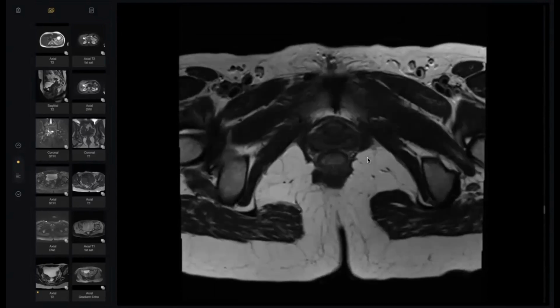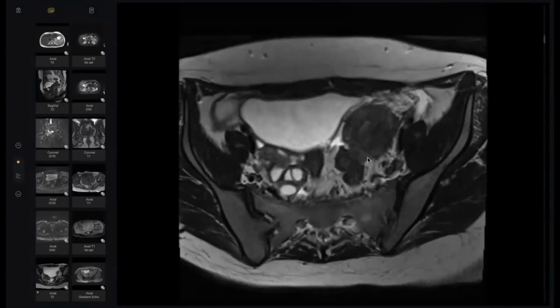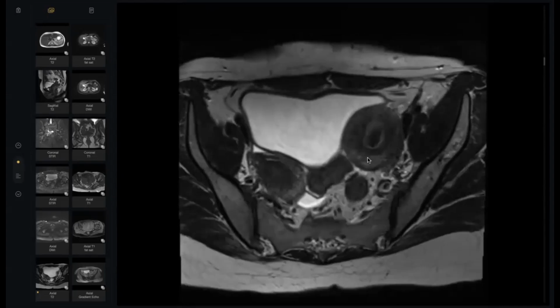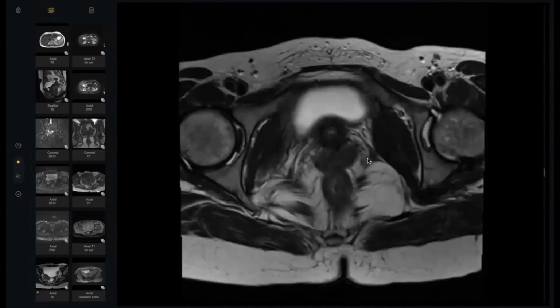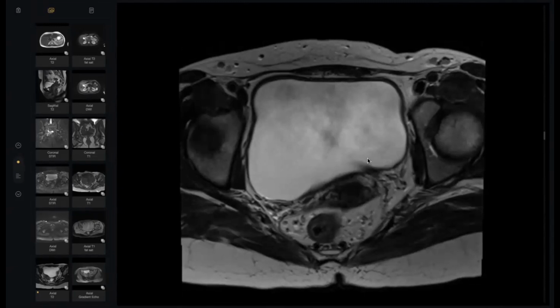On the T1, one of them was having hyperintensity within the lumen. The ovary is normally visualized. So this is the right ovary. I'm thinking along the lines that there is some uterine abnormality with a hyperintense component within one of its lumens. So might be one of the cavities is not having an outflow connection. Can I see any other plane like sagittal? Take whatever you want.